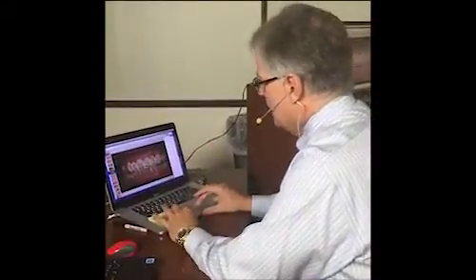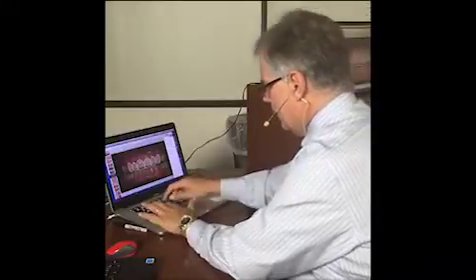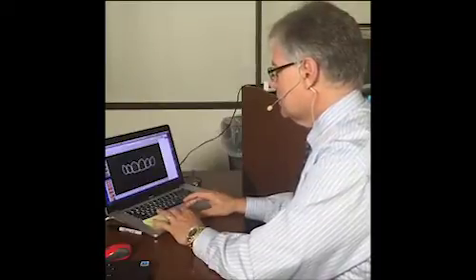Because here's what I can do next. I'm going to leave these undone. I'm going to duplicate that slide, and I'm going to get rid of the picture. So Command X. Now I am not distracted, and I can set proportion. And I would tell you, just believe what you like. I like long teeth, so I'm going to make these teeth a little longer. I kind of like those. Okay? Keynote will actually tell you the ratio, but I never even look, ever. My technician is going to measure it. I just want to see what that would look like. I want to get an idea, and what would I have to change?